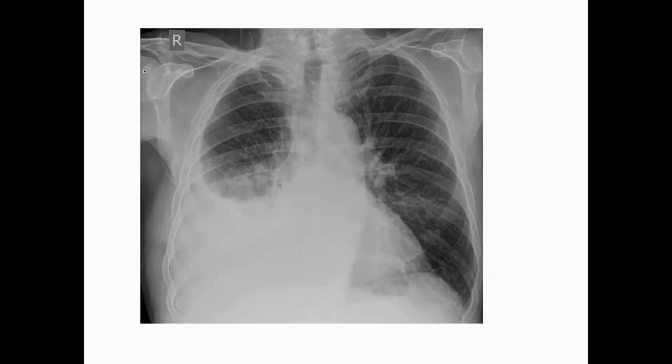Also, because the right cardiac border is obliterated, you cannot accurately measure the cardiac size, but you can assume here it's an enlarged cardiac shadow. If you measure from here, cardiac border until here, for sure it's more than 60% of the CT ratio, which is the cardiothoracic ratio. So here we have cardiac enlargement, upper lobe vessels dominant, and pleural effusion. These are all features of heart failure.